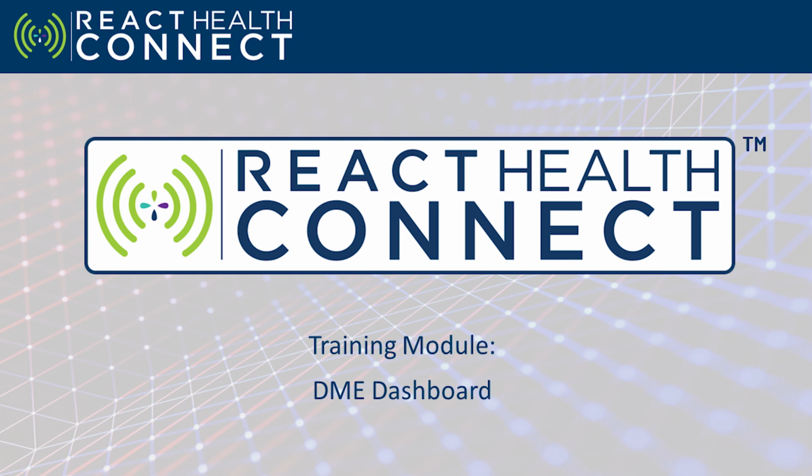Thank you for participating in this training module for React Health's cloud-based data sharing platform, React Health Connect. This module provides training for the dashboard in your React Health Connect DME account. In this dashboard training, we will show you how to use the new dashboard feature in React Health Connect.